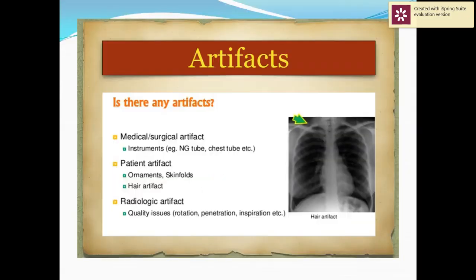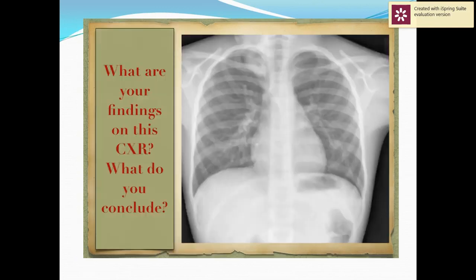An artifact, sometimes a medical surgical artifact: instrument, NG tube, chest tube. Sometimes a patient artifact, hair. Sometimes also a radiological artifact, the rotation with penetration with inspiration.